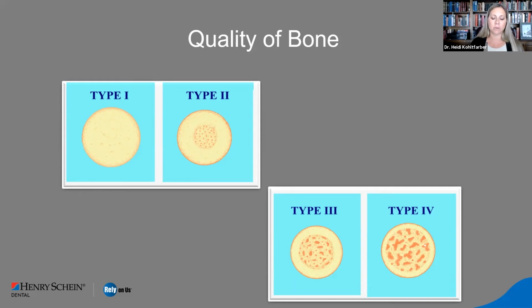And that has to do, again, with the inherent physics with the CBCT having an extensive amount of scattered photons that hit the receptor. And again, we can see that anytime we're trying to look at soft tissues, we can't differentiate soft tissues. In fact, if you were to use that Hounsfield unit button and put it on any of the soft tissues, you'll notice that the numbers vary quite widely.